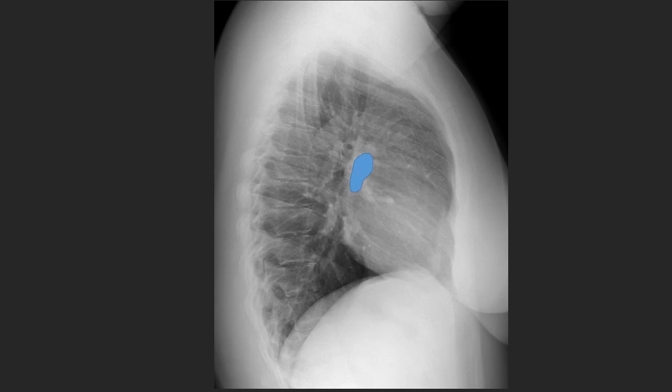The right main pulmonary artery, remember, is going to sit in front of the airways, so in front of and below the right upper lobe bronchus, the smaller circle. So we can see that here. This is what's known as the right vascular opacity, and that's because this is composed of both artery and vein overlapping. And then here's the airways, and you can see that it's sitting below the major airways. Whereas your left main pulmonary artery actually goes over the left main stem bronchus. So you can see that here. This is your left main pulmonary artery, and notice how it's going over the airway.